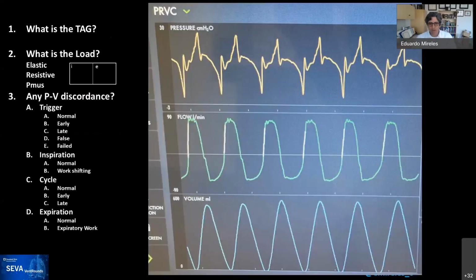So this is the first waveform. I'm going to put it there for a second for you to digest it. And then I will ask any of our team members, our fellow members, if anybody's interested in reading it. Again, I will point this out: this is a safe space. I learned from each one of these curves. We all get to learn. I know that it may be daunting to do it in front of everybody, but such is life. We're here to help you through it.